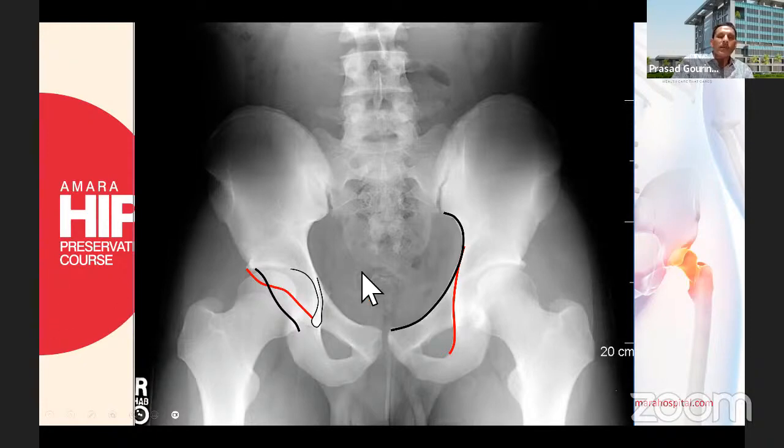That's a teardrop. A teardrop is not one structure, but a radiographic marking where the lateral border of the U is formed in the acetabular fossa. The medial border is by the Kohler's line. And usually, these two lines don't touch each other, and there's a nice U-shaped thing called the teardrop, right? A narrow teardrop is a sign of coxa profunda, not diagnostic, but it just indicates that maybe the acetabulum is deep. And a wide teardrop is more indicative of dysplasia. Again, it's not pathognomonic of dysplasia, but when you look at it, you pay more attention to the coverage to see if it's dysplastic.